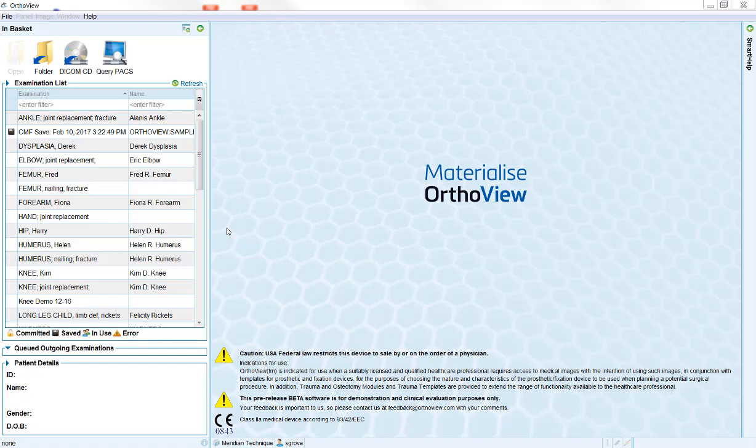Note, if OrthoView is open directly from your PACS viewer, you should consult with your PACS manager or IT support manager regarding how to launch the software from your PACS. For most people launching Materialise OrthoView as a separate application, images will be imported using the Query PACS function. This allows you to directly search and import images from your PACS database.